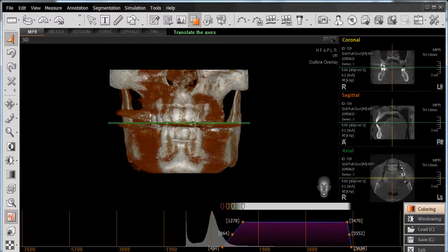You'll note the orange numbers along the bottom of our scale, such as negative 1900, positive 1900, 3800, and so forth. Referring to the Hounsfield scale as a reference, where distilled water at room temperature would be 0, that would then indicate that any density greater than the density of water will have a positive number. Any density less than the density of water will then have a negative number. In this case here, air has a value of negative 1000. The cortical bone typically 1000 and higher. Enamel of the teeth about 2000, metal 3000, and so forth.